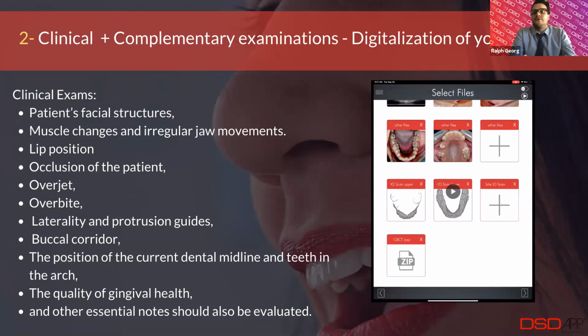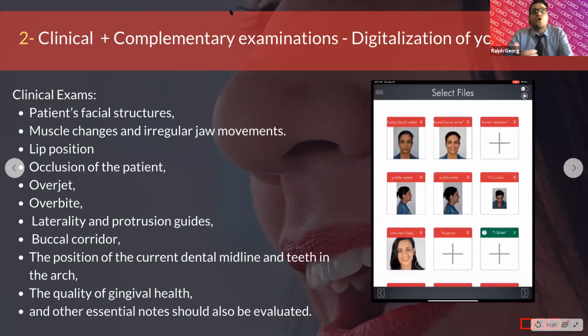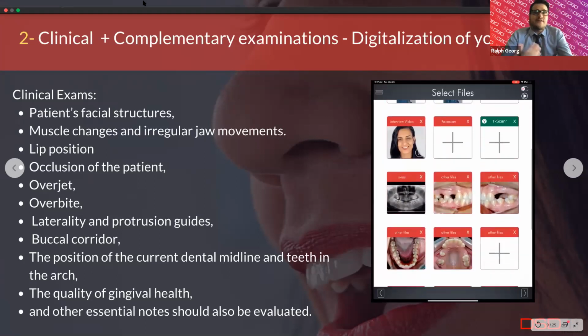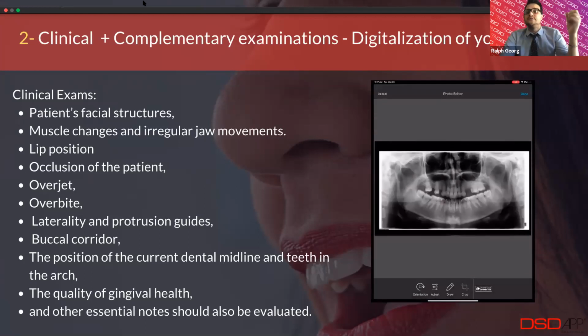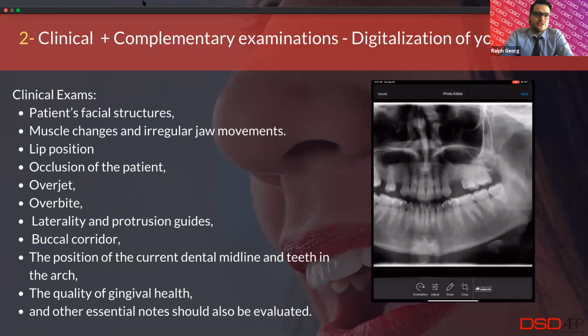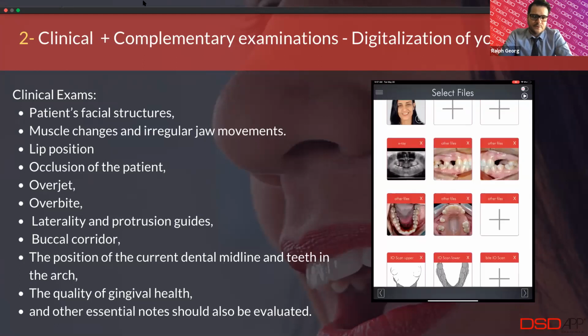With this, as Dr. Diogo is explaining, you can actually make this your point of reference. These files will live in here, in our cloud. Our cloud technology is some of the best in the world. And it's great not only for you, the clinician, but for your staff too. If your dental hygienist needs to pull something out, or your office manager is having an issue with an insurance claim, you can just go to the app, pull up the file, and just like Dr. Diogo said, you just export it. It's as simple as that. And that's a huge win for the office.